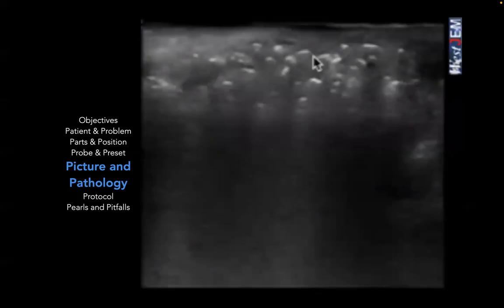In the more acute scenario, let's say in the hospital setting, there are also necrotizing soft tissue infections to look for. And this is an appearance of necrotizing fasciitis, of air that's seen underneath and within the soft tissue. Think of air as the enemy of ultrasound waves. When air is seen or crepitus is palpated underneath the skin surface, it refracts those ultrasound waves all over the place. And so the sonographic appearance of necrotizing fasciitis is these bright white specks within soft tissue.